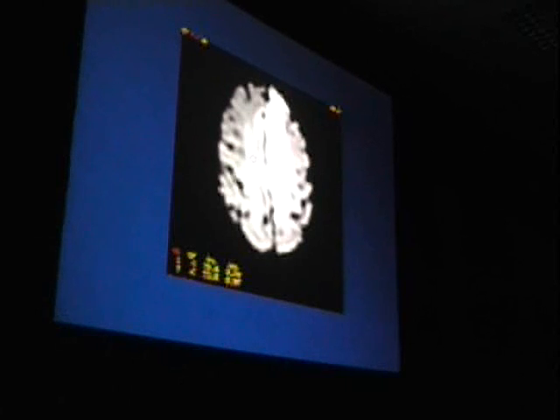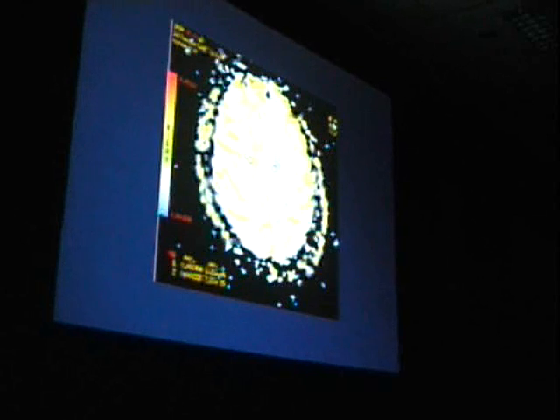in the same location as the infarct seen on the proton density. Now, the problem when interpreting diffusion-weighted images is to find whether the high signal is related to true restriction of diffusion in an acute infarct, or if it's just T2 shine through. And you do this by an apparent diffusion coefficient map, or ADC map, which by mathematical methods removes the T2 effects from the data set.